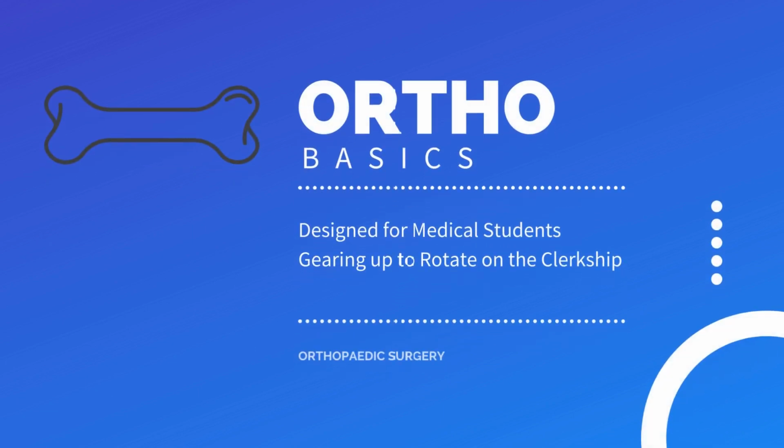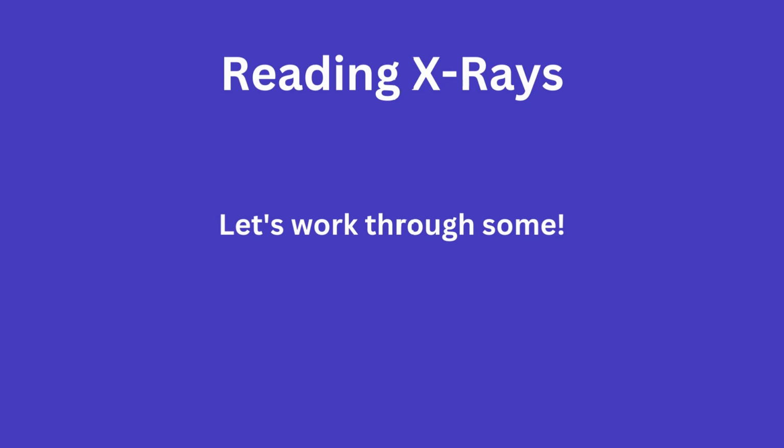For today's topic, we will be talking about how to read an x-ray. Being able to read an x-ray in front of the team is an essential and very common thing that comes up. Thus, knowing how to approach these is important. So let's go over some examples together.